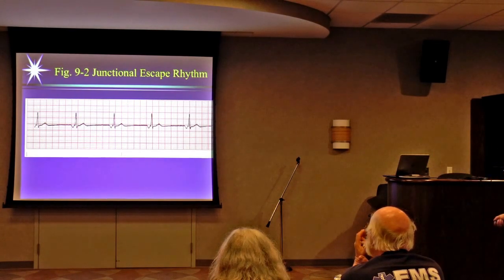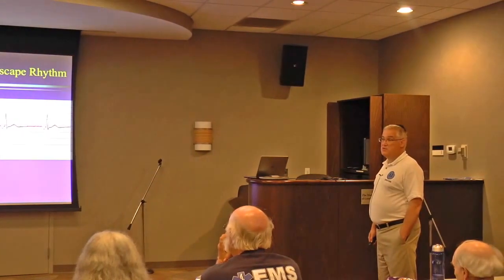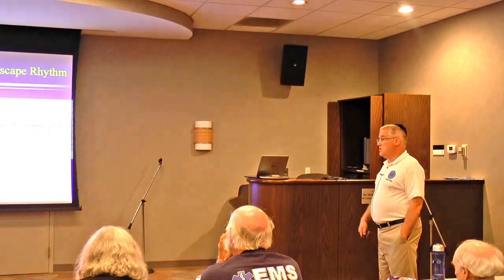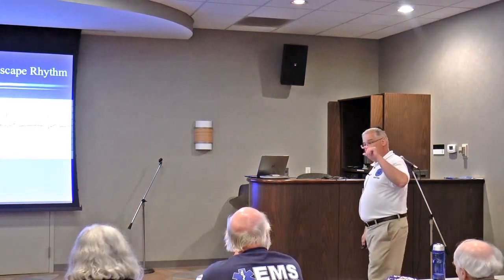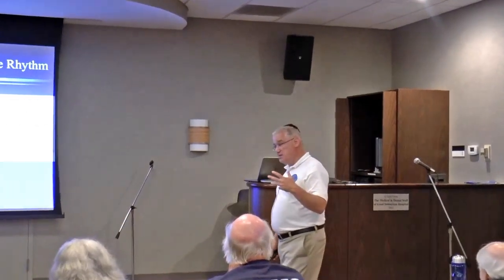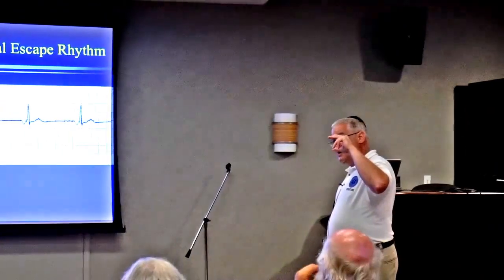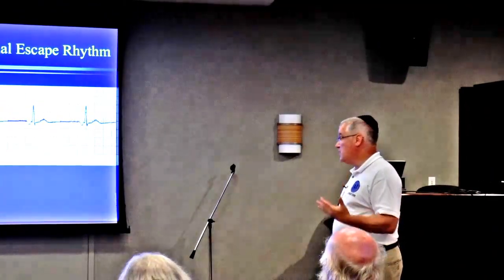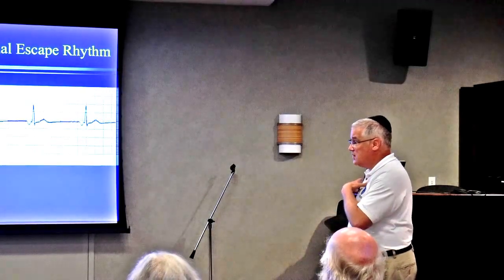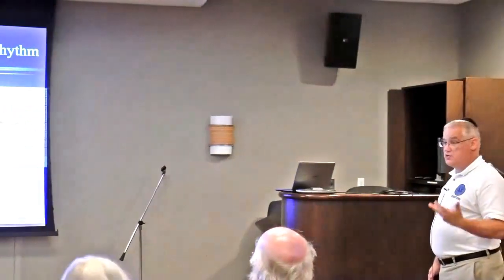Okay? So that's it. It's usually pretty easy to pick up on if the P waves are prominent. Somebody, I think you showed me one before where the stylus on the paper was pretty light, so it was hard to see. The paper was faded. And the complexes were not that high, the amplitude was not that high. That could be because the person's older, they're not generating enough electricity, or maybe the electrodes were not so clear. So the ease of making an interpretation is really based on the quality of the tracing you get. And the quality of the tracing we get in EMS is bad.